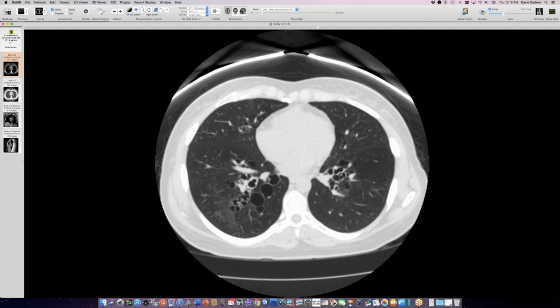I think this one is congenital. And there are no specific pathologic findings for Mounier-Kuhn or for Williams-Campbell, and so these diagnoses are rather squishy. You just have to take the literature with a grain of salt about somebody claiming it to have one of those names on it. So I think this one is a reasonable candidate for Mounier-Kuhn, given the central involvement.